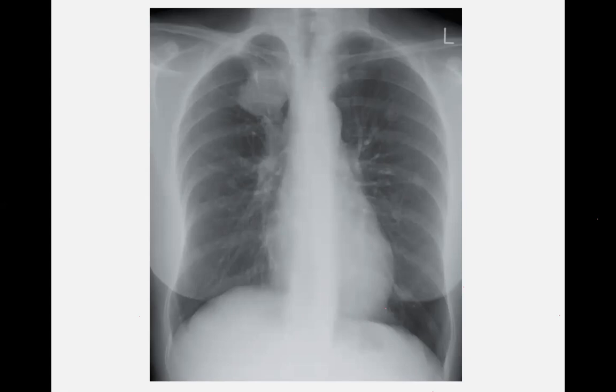And what about the breathing, which is the lungs? اللنجز والله ما أعرف بالضبط شلون أطلعهم. هل هم الخطوط البيضاء هذه؟ صح، في خطوط بيضاء شويه اكثر من الطبيعي. حلو. بس شنو الشيء اللي تشوفه obvious اللي غريب شويه بالصوره هذه؟ أحس يمين غير عن اليسار. ليش؟ أول شيء اليمين فوق صوب الكلافيكل في شيء حلو، دائري. حلو، هذه عدل. واليمين أصلا في خطوط بيضاء أكثر.